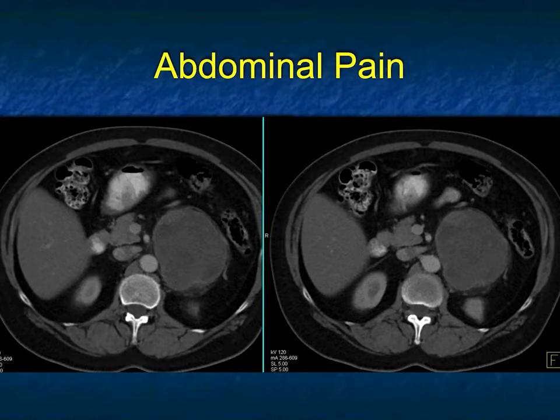This patient has abdominal pain, and you see a mass in the region of the left adrenal bed. And yes, I want to make sure it's not coming off the stomach like a GIST tumor. I want to make sure it's not coming off the tail of the pancreas. I want to make sure it's not a retroperitoneal mass proper. But I think on the epicenter, again, 2 images, that's not going to be a real study, but I'm going with adrenal. Adrenal mass, you could think of things like pheochromocytoma.